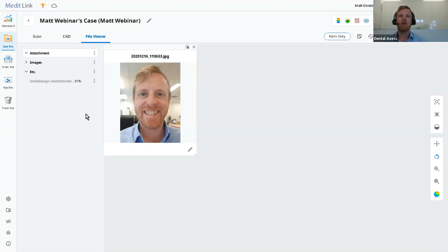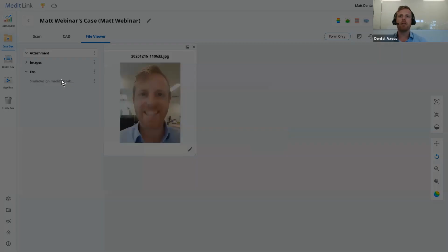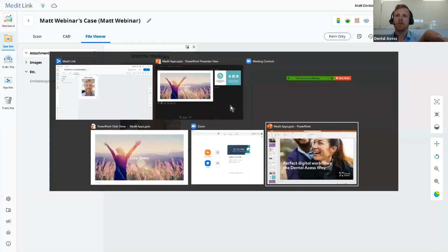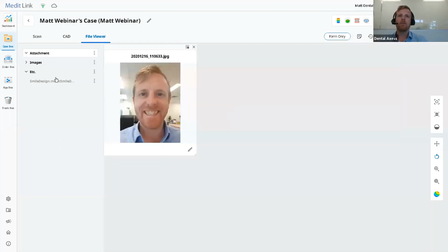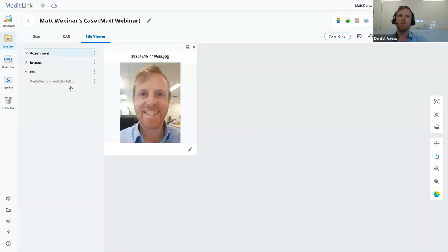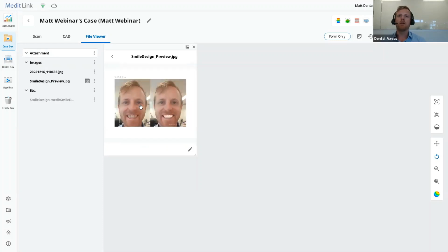So we're just about there with my photo. And we're almost there. Just give it one last moment. And then we'll have the photo of me. We'll just give that a moment, sorry. So you can see it's really easy to quickly generate this. And here we go. Here's our Smile Design preview.